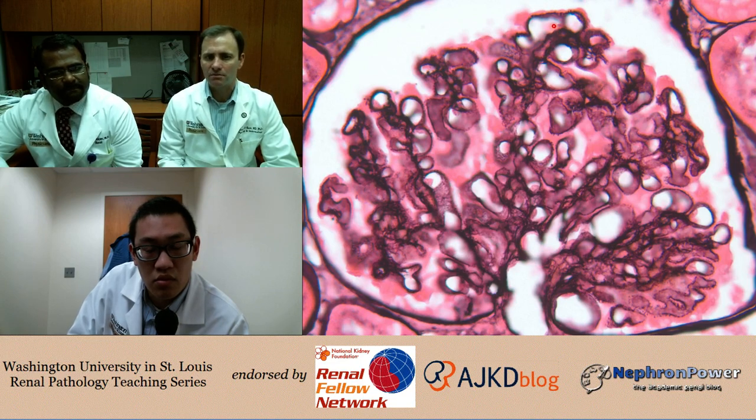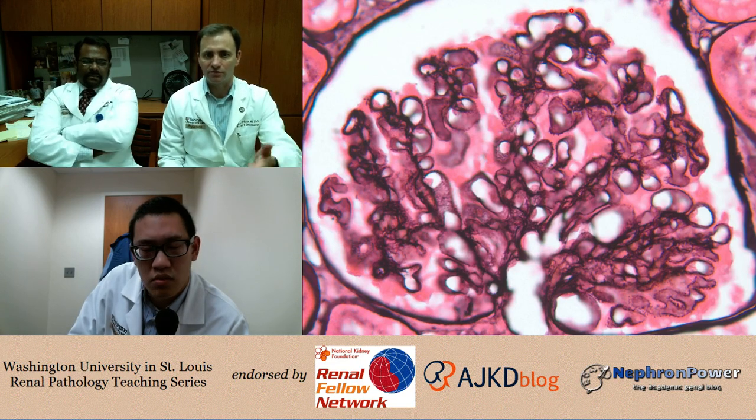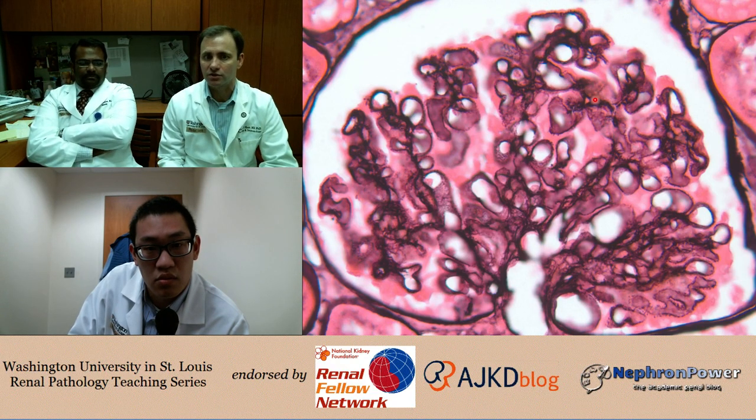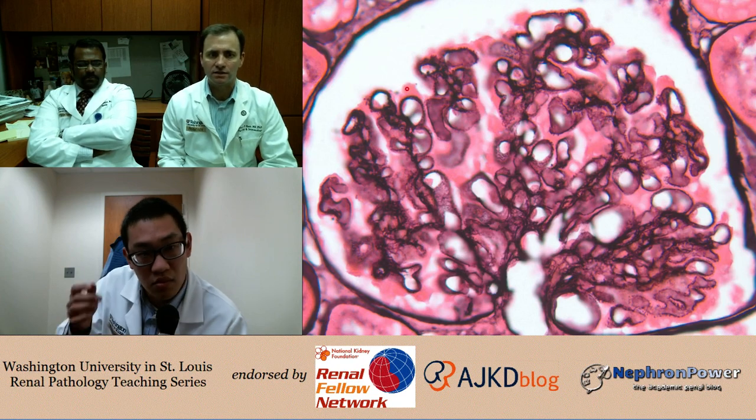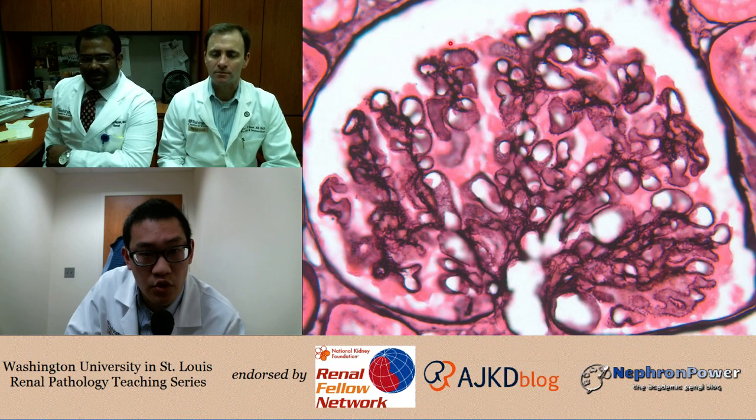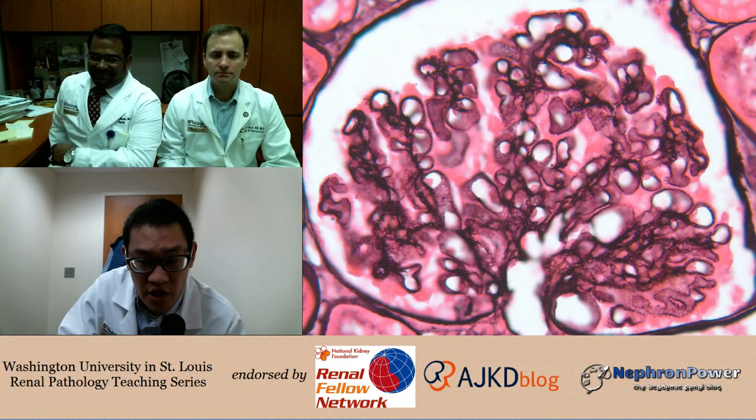Now, you can imagine if you took one of these capillary loops and flipped it and looked at it from the top down, what you're going to see are a bunch of little holes. So sometimes these will be referred to as pinholes. I don't see them really well. Maybe down here we're getting a section like that where you can see these pinholes in addition to the spikes. It all just depends on the orientation that we're looking at these. Okay. And so this looks like membranous.